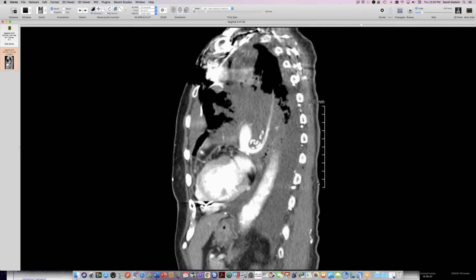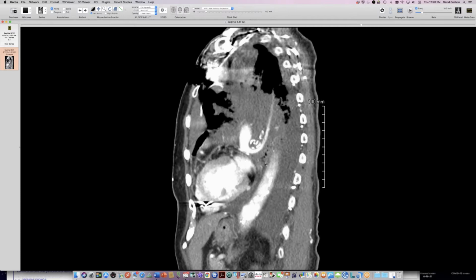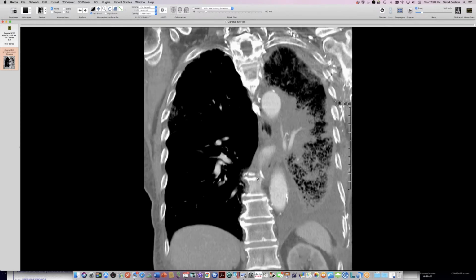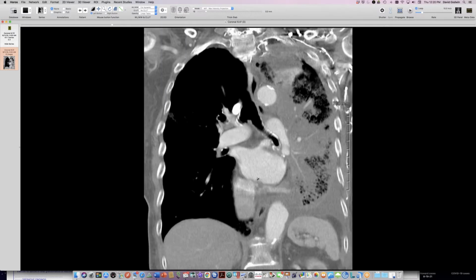I have very limited imaging on this, but you can see the twisting course of these vessels reflecting the torsion. I have one more for you from this outside case. I don't really see the beaking that I'd like to see here, but this was torsion following a thoracotomy as well. So, 2 cases of torsion.